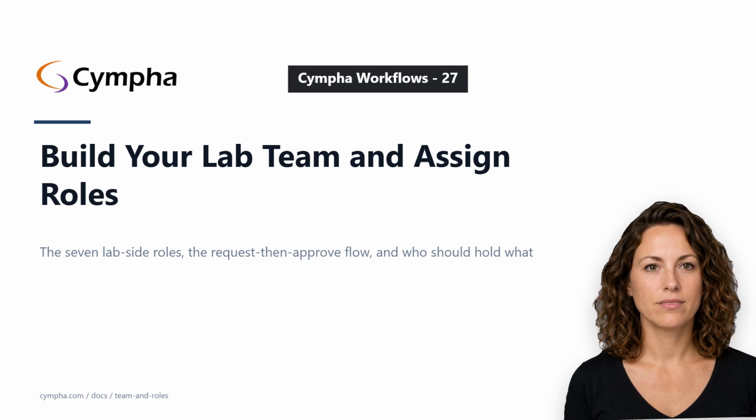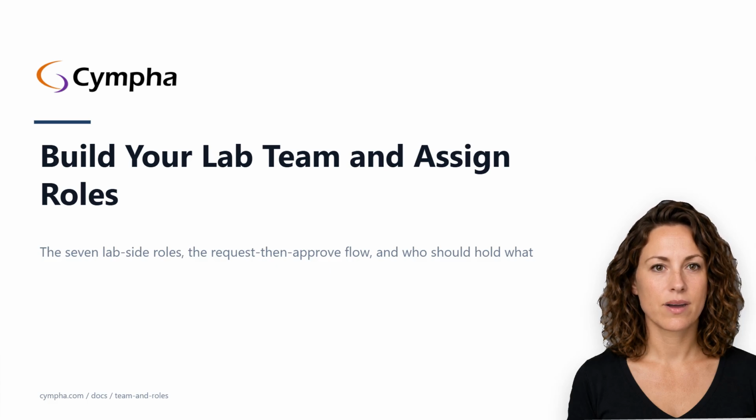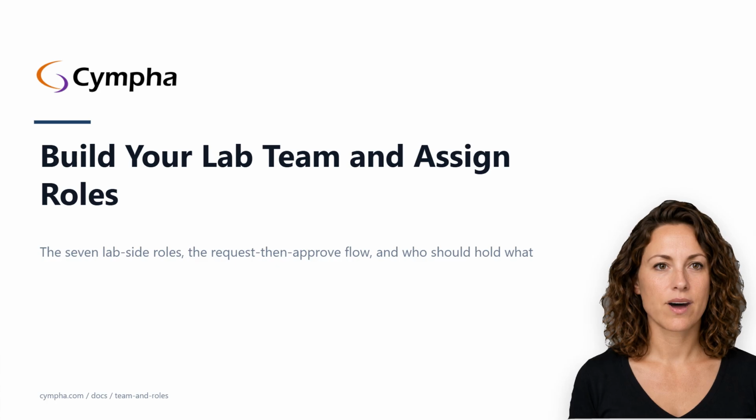Welcome to Guide Mia. Today we're going to talk about building your lab team on Cympha and assigning roles. This one is for lab managers who have finished onboarding and now need to bring in designers, case intakers, AlignerBot operators, manufacturing engineers, and other coworkers.